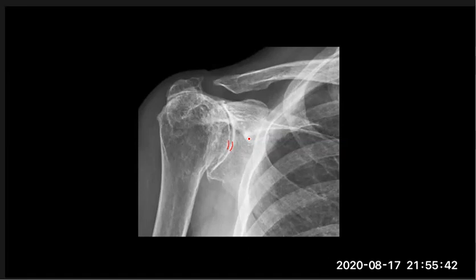Hyperparathyroidism, one of the main differential diagnoses. Other differential diagnoses? Calcium pyrophosphate deposition disease. No. But post-traumatic. Okay. Could metastasis give the appearance? Maybe, yes. Maybe metastasis gives the appearance. And in this case, it is rheumatoid arthritis.